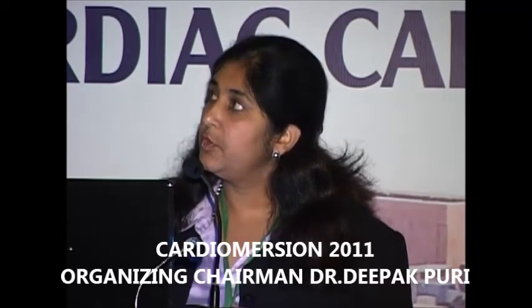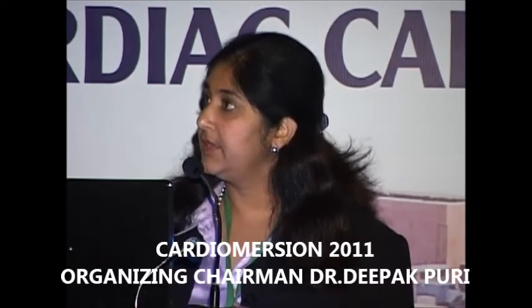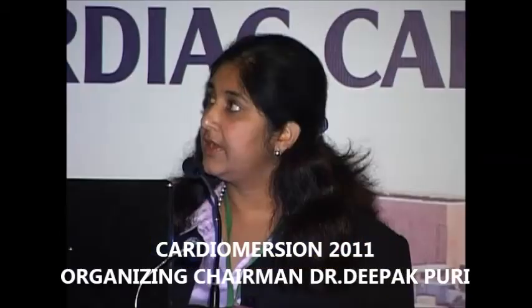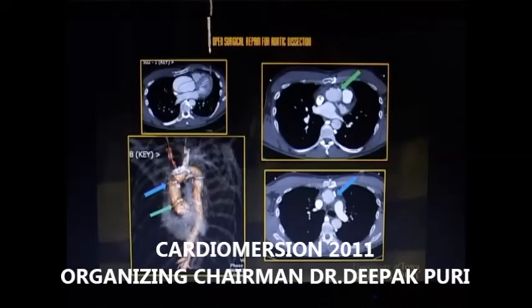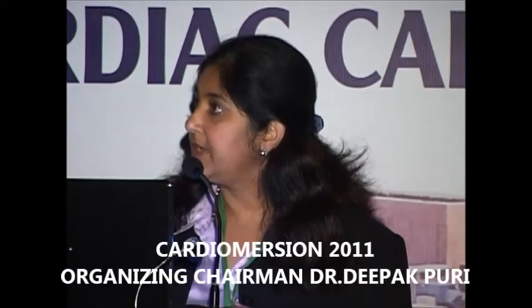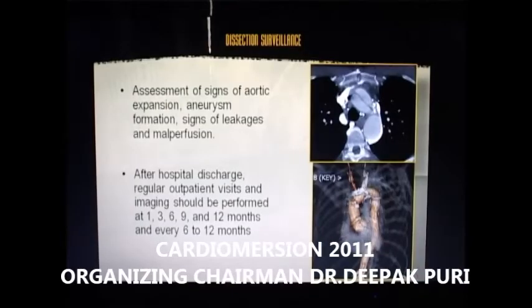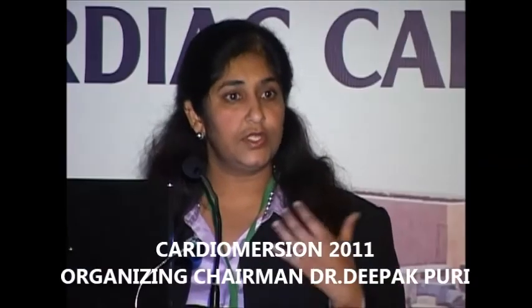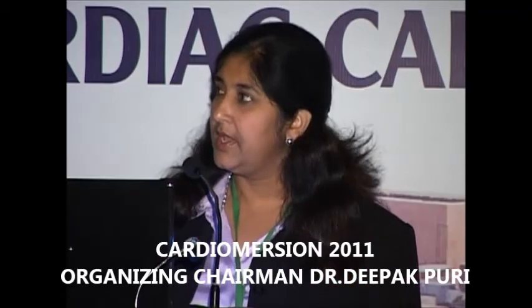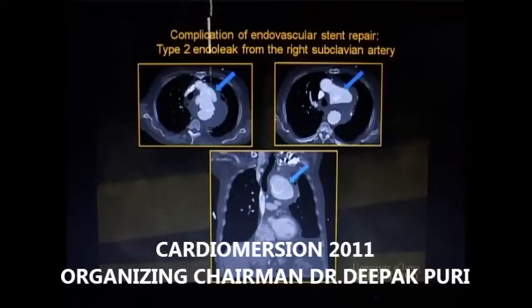This is an example of open surgical repair. Here, this was his pre-surgical image. So this is one graft and this is the other graft, and as you can see on the reconstruction very well, this is a Dacron graft which has been replacing the ascending aorta. Now, surveillance, I will not get into that, but this is also a beautiful case where we did an endovascular repair and there was leakage of contrast outside. So this was an endoleak which was happening from a subclavian artery, and this patient died about 6 hours after this study.